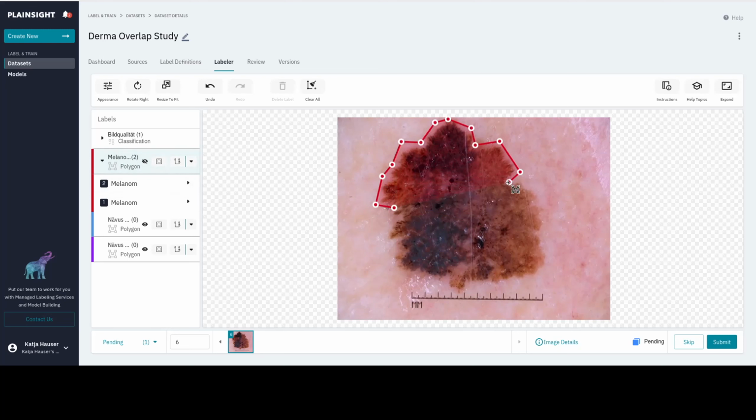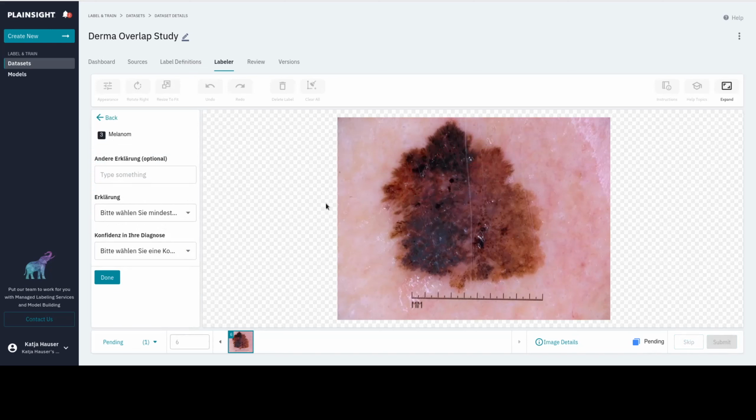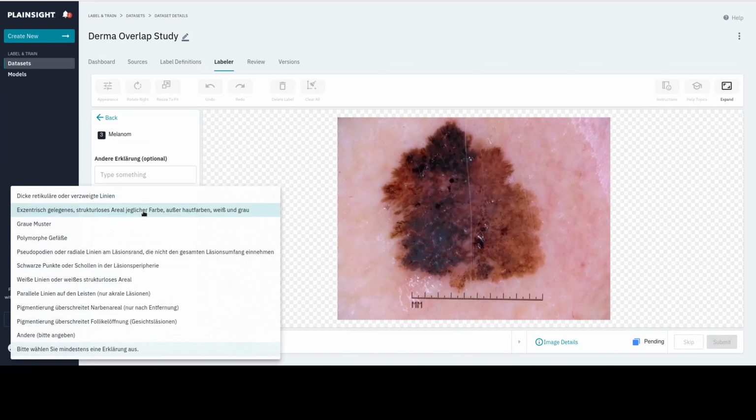Since this is only about the lines at the margin, I actually annotate the margin from inside again with some distance. When I end annotating right now, this new annotation will also become hidden because I hid annotations before, but this is normal, so don't worry about it.